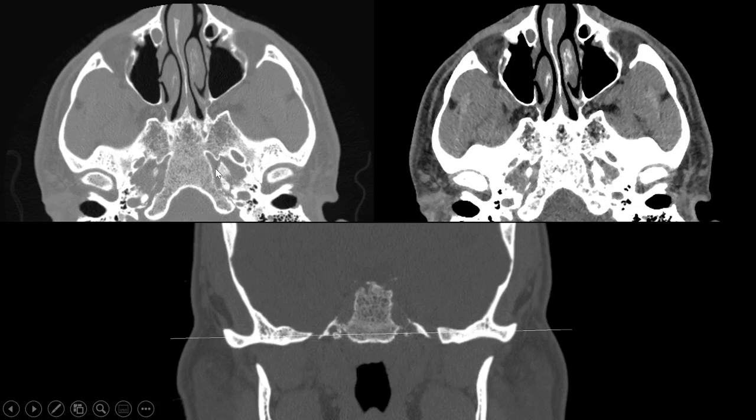Parallel to the irregularly shaped foramen lacerum is the footprint of the skull base, including foramen ovale and foramen spinosum. Note that foramen ovale does have an oval-shaped configuration, and foramen spinosum has a small rounded configuration. These directly parallel the irregularly shaped foramen lacerum, which contains cartilage. Foramen ovale and spinosum together are often referred to as the footprint of the skull base.